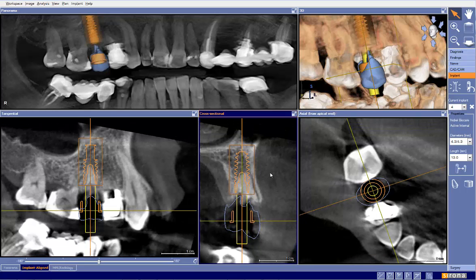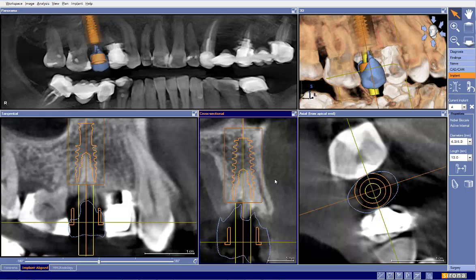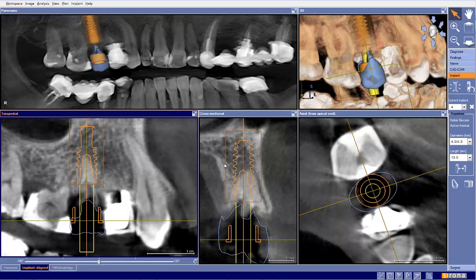In terms of the lingual plate, how close we are there, not an issue. That's pretty dense right there. It's a good cortical plate. Good cortical plate here on the buccal. Pretty straightforward. I would personally go ahead and add some bone in the extraction site, in the quote-unquote gap after we take the tooth out. So everything looks pretty good here.